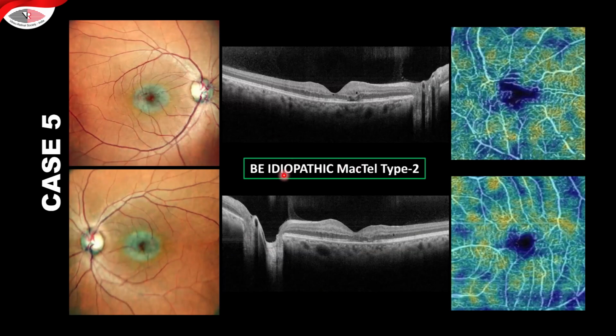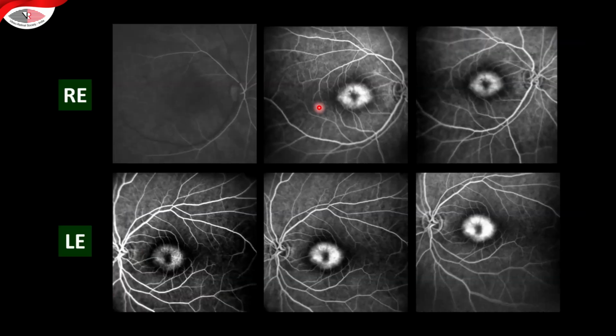This is again bilateral MACTEL type 2. You can see this grayish concentric area on the macula clinically, bilaterally symmetrical. Correspondingly, you may see some changes on the temporal aspect of the foveal area.